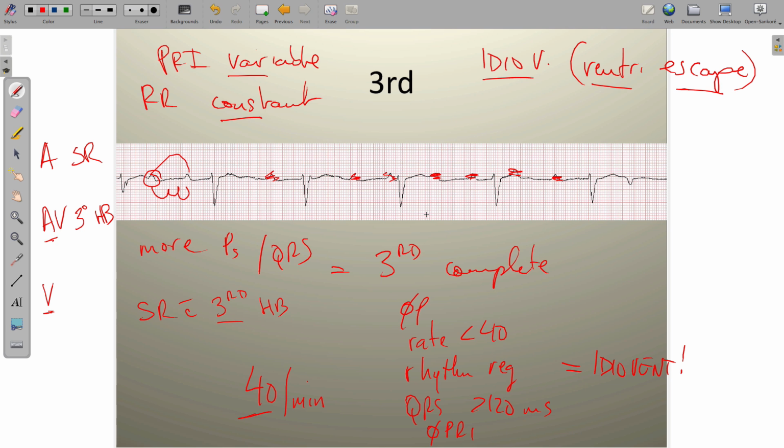It's idioventricular rhythm. In addition to that, look at the discordance that exists between the QRS and the T waves. They're pointing in opposite directions. So QRS and T wave discordance is another great way to look at this tracing and say, hey, we actually have a level of dysfunction here, and it is a ventricular rhythm that's causing this. All right, so we're always going to look at that.